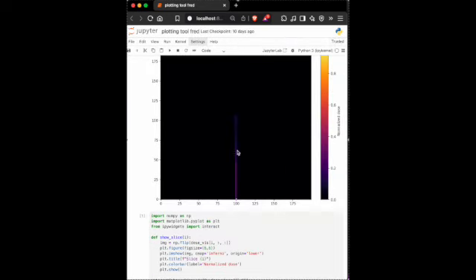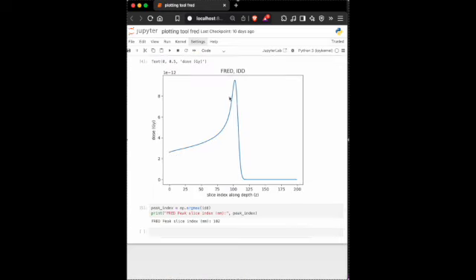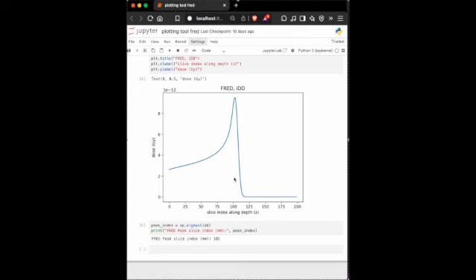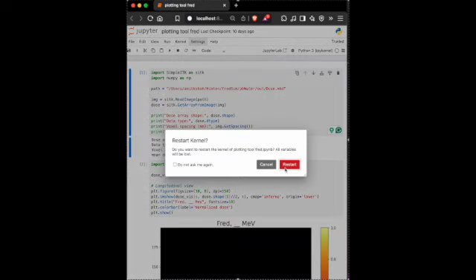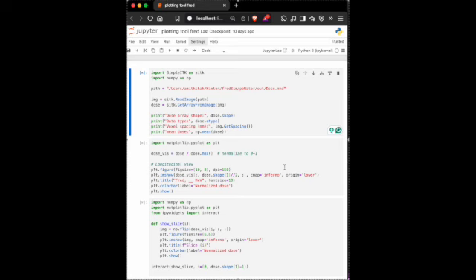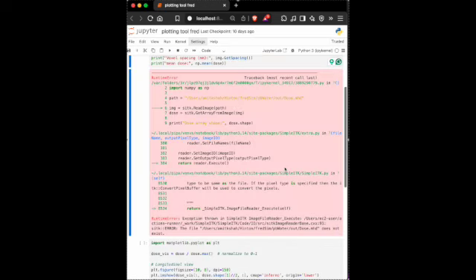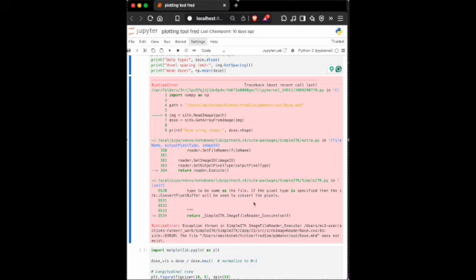Yeah, I was already doing some work with pencil beam with different energy. So for example, you see I was doing this one with maybe 120 MeV, and now I have 100 MeV. So it is at 102. It should change. For 100 it should be lower. Does not exist.